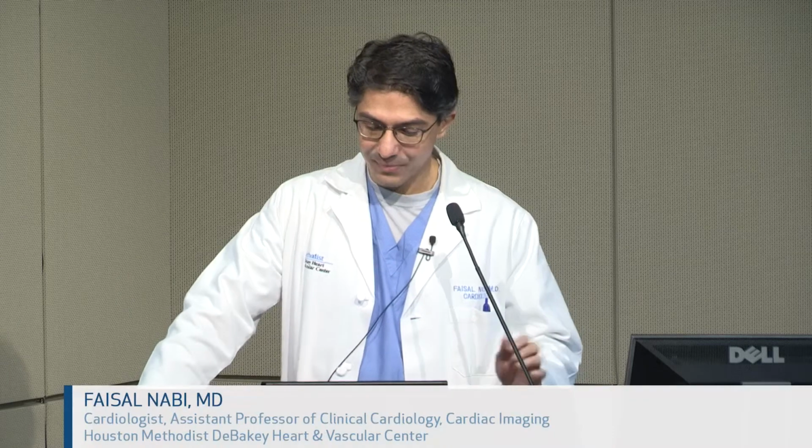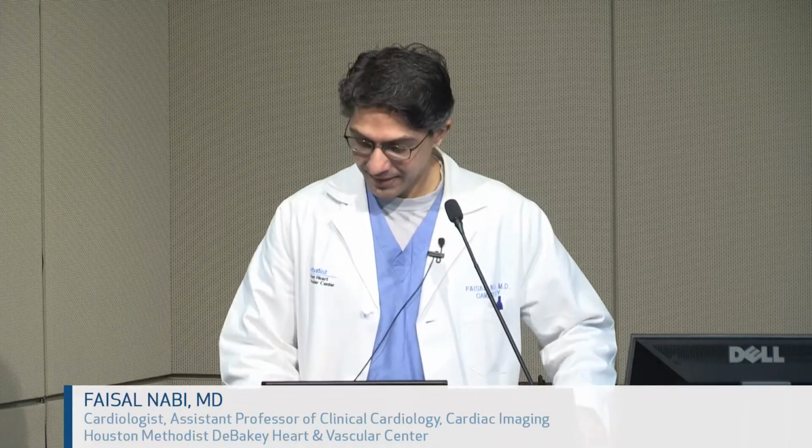Good afternoon. I will be discussing the valvular assessment by CMR portion of it. Before we get started, it's important to know what kind of sequences CMR has. What kind of sequences are the real strength when it comes to assessing valvular heart disease?